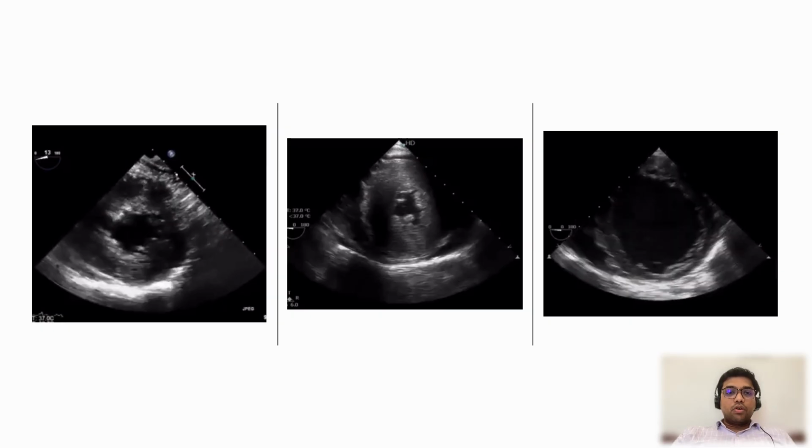In concentric hypertrophy, there is almost obliteration of your internal cavity by the increased muscle mass. In eccentric hypertrophy, there is an increased volume inside the LV, so the left ventricular end diastolic area is more. Though the wall seems to be thinned out, it is actually hypertrophied, and the muscle mass is frequently even more than in concentric hypertrophy.